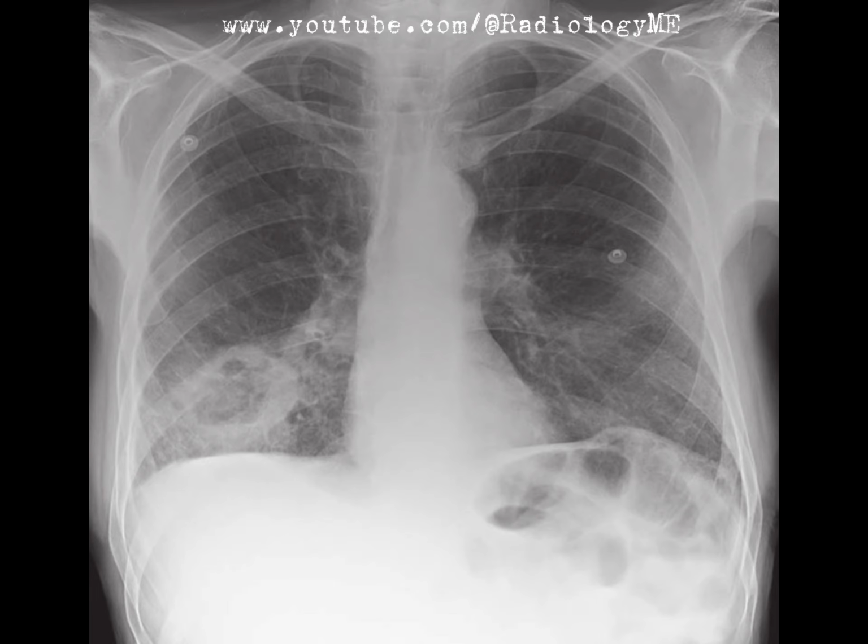analysis. Now, examiners may ask, what about the possibility of infection causing this appearance? That's a valid question, and infection must remain on the differential, especially if the patient has a history of recurrent pneumonias or immunosuppression. A mycetoma can form in a cavitated lesion, and infections such as tuberculosis, TB, or fungal infections like aspergillosis can also produce cavitating lung lesions.